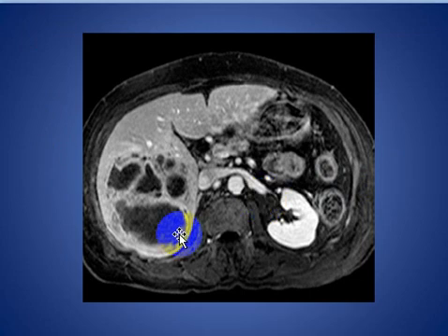As we see here, pyogenic abscess, MRI shows multi-septated mass or a cluster of adjacent masses, as we see here involving most of the right lobe, segment 5-6, with contrast enhancement of the septi and surrounded by inflamed liver.